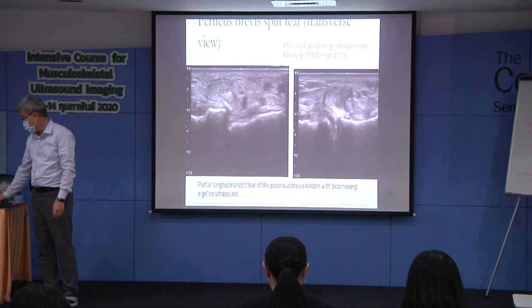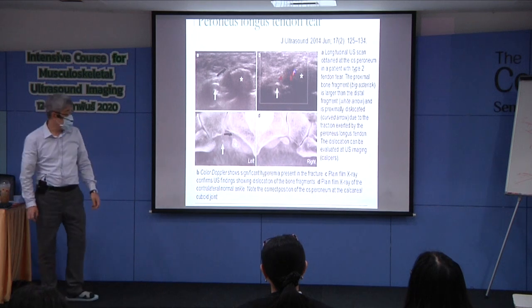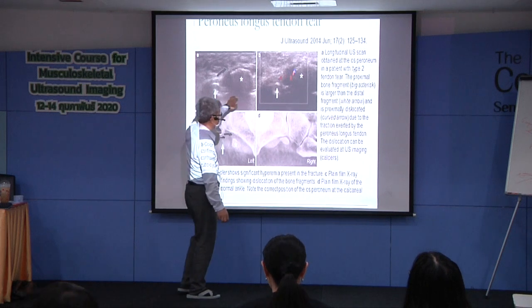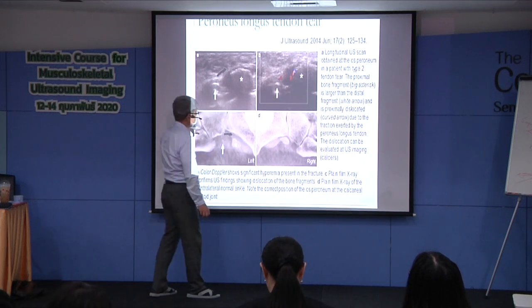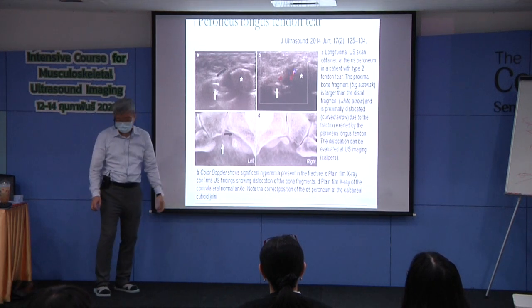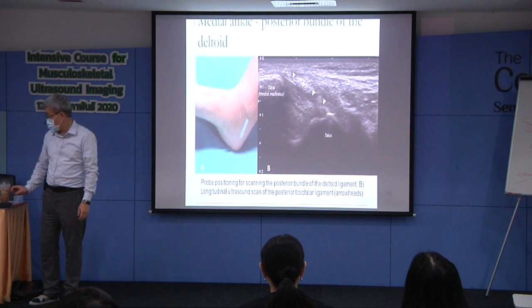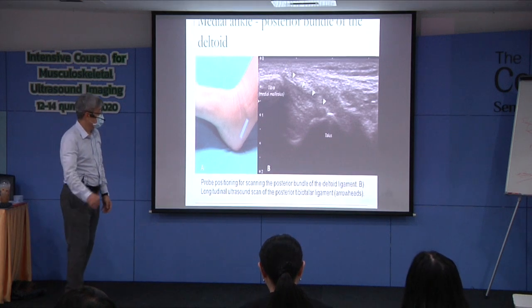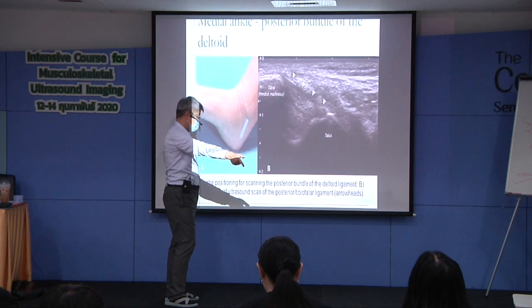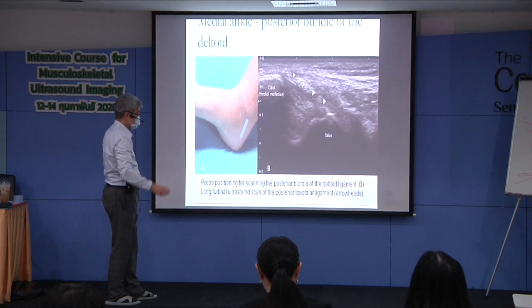I do not often make a diagnosis unless it is too obvious. Okay, this is a good example. A tendon trauma, they checked with color Doppler and found that this is a peroneus longus tendon tear, and it was also confirmed by X-ray. For the medial ankle, we often check tibialis posterior, flexor digitorum tendons, flexor hallucis tendons, and also the tarsal tunnel, and also the nerve.